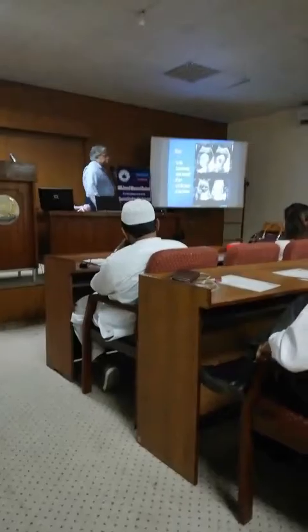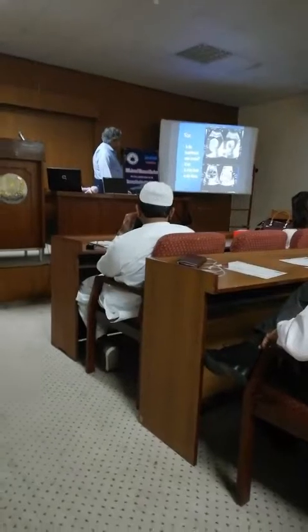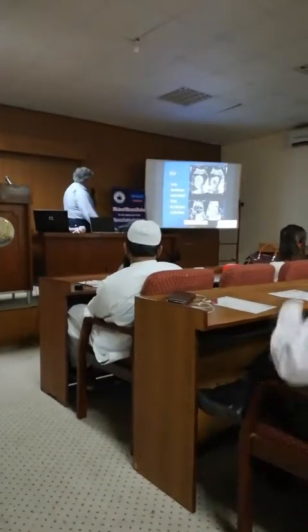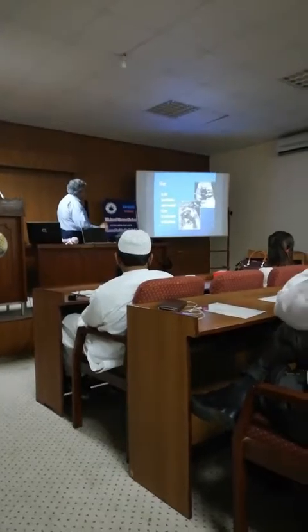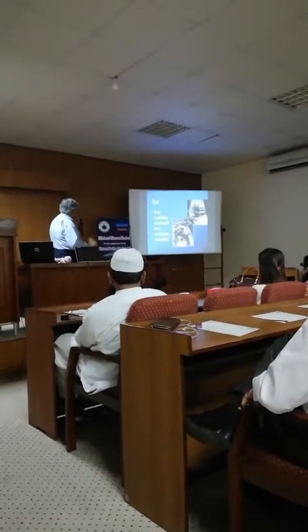What about this one? Big heart or small thorax? Big heart. All right. So this is probably 80% of this. So you need to see both the abdomen as well as the thorax when you are trying to look at the cardiothoracic ratio.